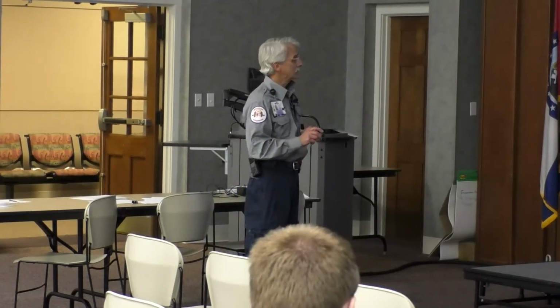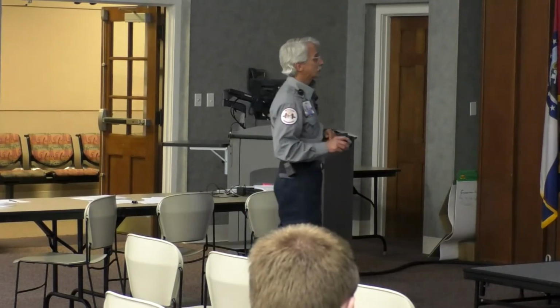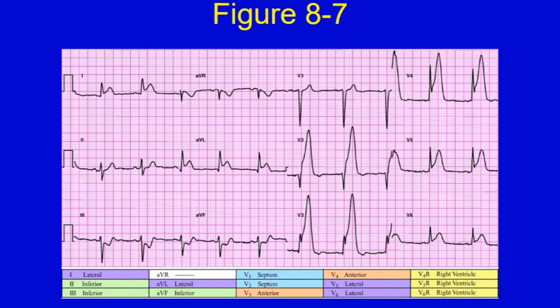All right? What leads have elevation? 2, 3, 4, 5, 6. Okay. V1, V2 through 6, AVL, 1 in AVL.